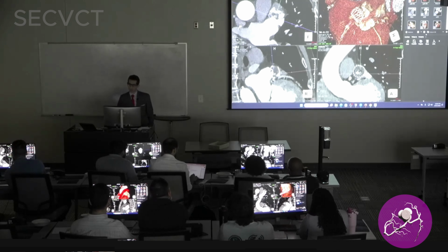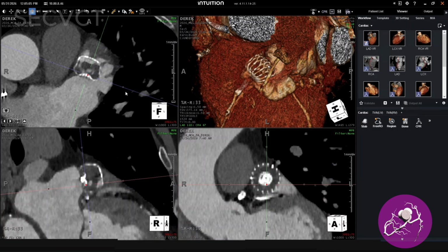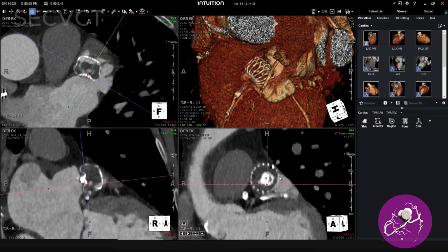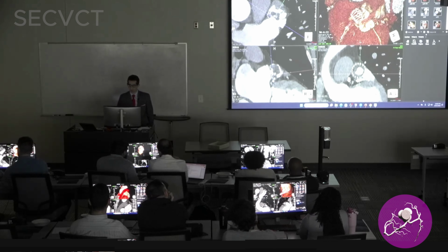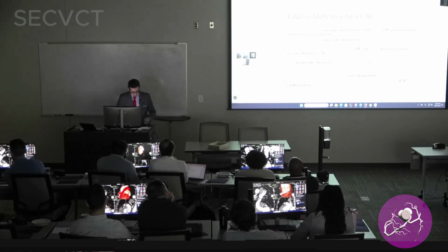I think it was like 10 by 9 millimeters or something. You can measure it here. Like if I go back and forth, you can appreciate how big it is here on the short axis. This is all uncovered lobe. So we talked to the team, and the plan was to attempt with some plugs because this is not in any form covered.